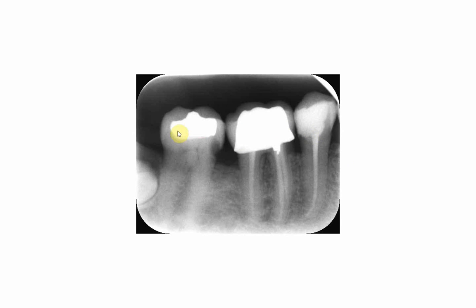Here we can see that this is an amalgam filling and there is no liner underneath. By the way, in some cases, especially with open margins or old amalgam fillings, due to microleakage, zinc phosphate cement tends to resorb by the oral fluids, so you don't always see the liner or subliner present underneath the filling.